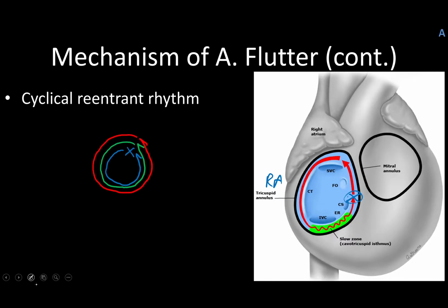And so what that does then is that's what causes it to make these flutter-shaped waves, where you get the flutter, the sawtooth specifically.